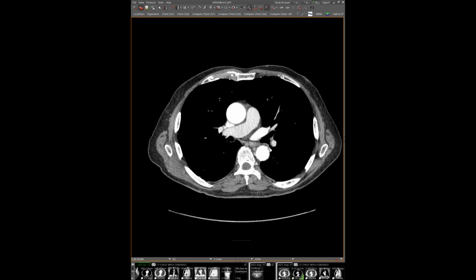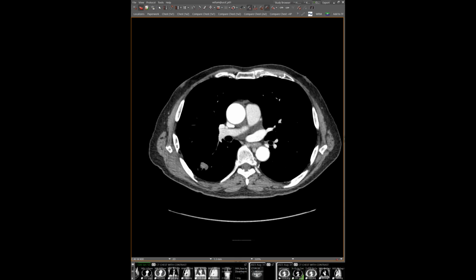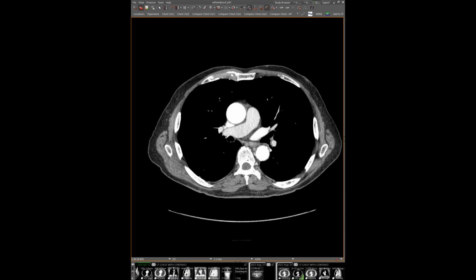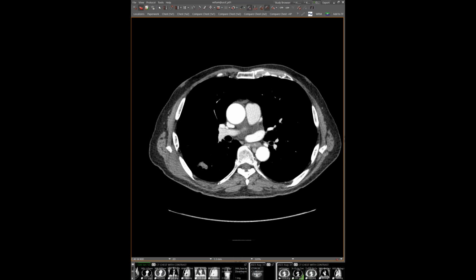nicely mimicking an elastofibroma dorsi, but again, it's a little bit too posterior, not right between the scapula and the rib. But just a good reminder, always make sure things are not changing more rapidly than you anticipate. That's a good case. I've never seen elastofibroma grow or just appear overnight. Exactly. I'm sure if you go back many, many years, it obviously pops up at some point, but yeah, this was really fast.